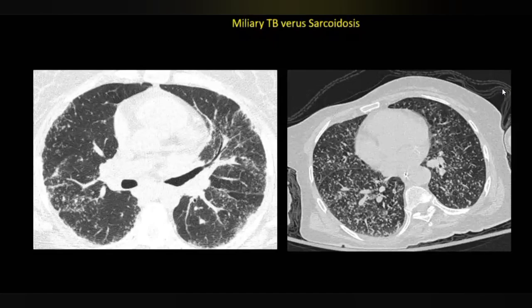The differential diagnosis for the random distribution of the lung nodules includes, as you mentioned, miliary tuberculosis. Anything else? Miliary metastases. Miliary metastasis from where? From thyroid and renal cell carcinoma, correct. Anything else? Pneumoconiosis can also be in the differential. But not the random pattern. The random pattern is hematogenous spread. Okay? So the other type is the hematogenous spread of fungal infection like histoplasmosis. Okay? Yes, sir. Fungal.